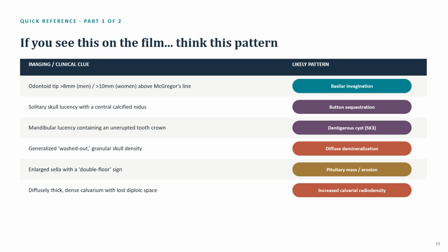Now, even though skull imaging might be few and far between, just because a lot of these patients go to CT now, there may be opportunities or chances that we see these things, and this just gives us an idea or a clue on what normal looks like versus what abnormal looks like.